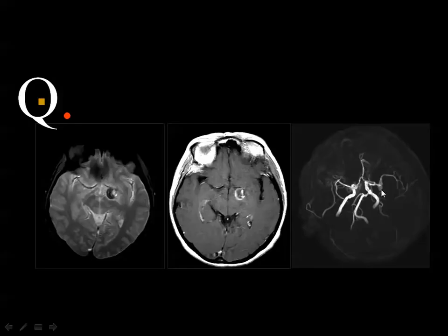Yes, very good. And you see a part of the lesion. This is an aneurysm with a partially thrombosed lumen. This is the patent lumen, and the rest of the aneurysmal mass is not seen on angiography, denoting that there is a thrombus. And whenever you inject contrast material and you get some turbulence of the contrast inside the aneurysm, this is a helpful sign.